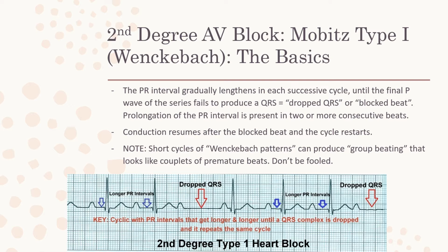So you can see here in this very first rhythm, I'm trying to bring up my pen. Hold on. There we go. Sorry, let me erase that so that doesn't confuse you.